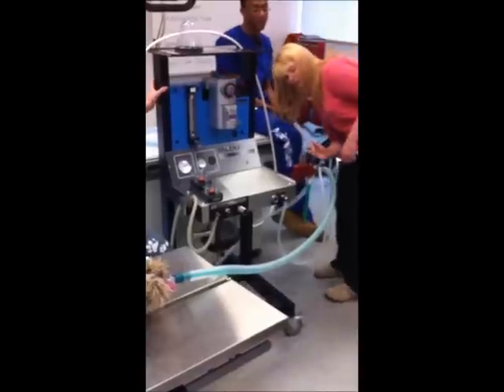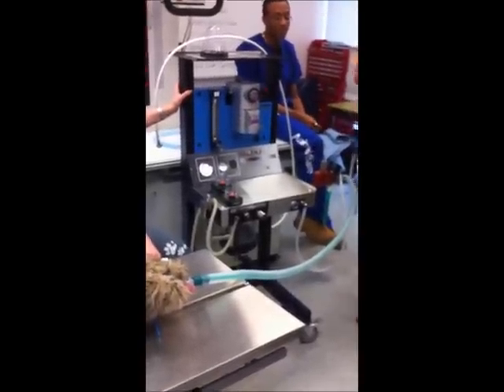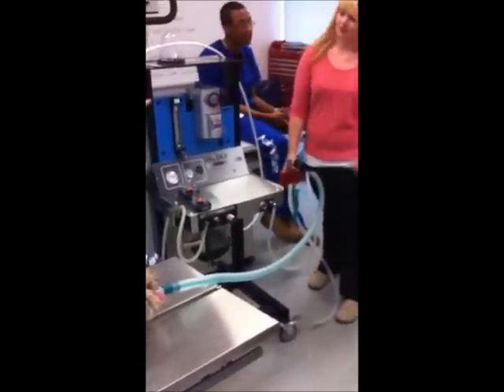Oh, that one on the bottom? The bottom, yeah. I think. Don't quote me, but I don't know. It seems open. What do you guys think? Is she going to the right spot? I thought it stayed in the back.